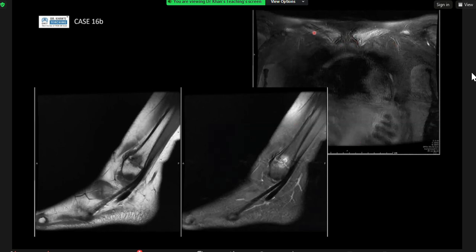So there's MRI here now proving that on the right side you've got abnormal marrow edema. You can't appreciate the periosteal reaction as well, but maybe there's this elevation here and at the bottom as well, and also on the left side, so bilateral clavicular involvement, and in your tibia and fibula, and it's the fibula because you've got your peroneal tendons running along here.